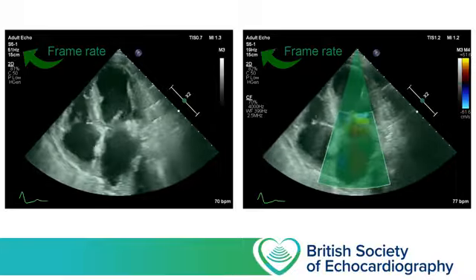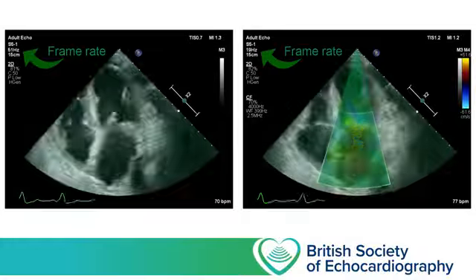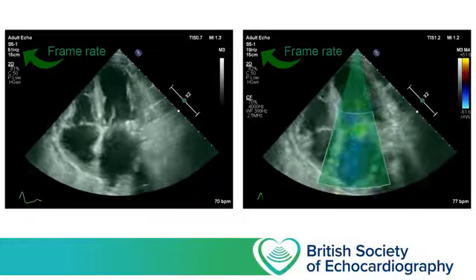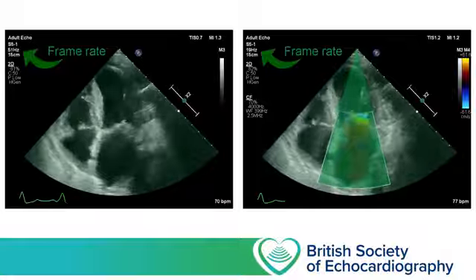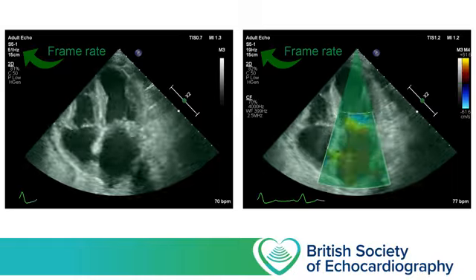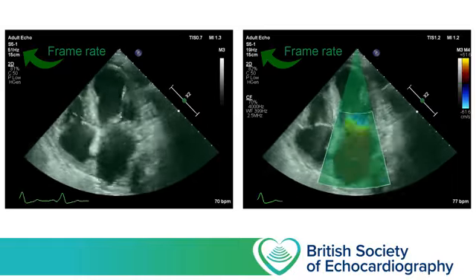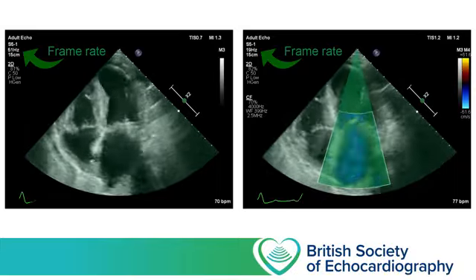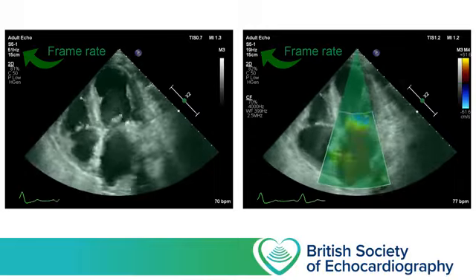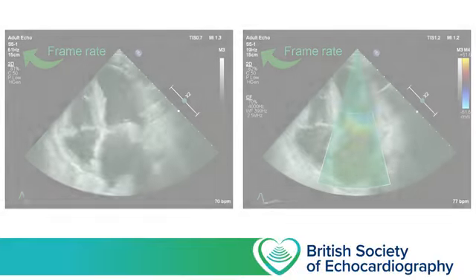And when we think about it, this makes sense because we can't send ultrasound down to those deep structures without having to pass through the near structures first. So adding colour to your 2D image is going to significantly reduce your frame rate. And the biggest determinants of how much your frame rate will decrease are the width of the colour box, because this determines how many lines are involved, and the maximum depth of the colour box, as the maximum depth dictates how long the ultrasound machine needs to wait before it can send out the next pulse of energy.